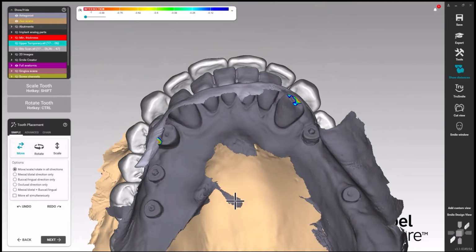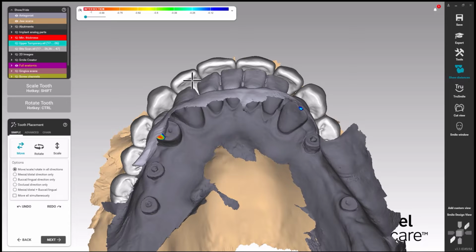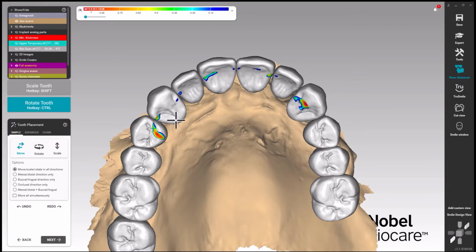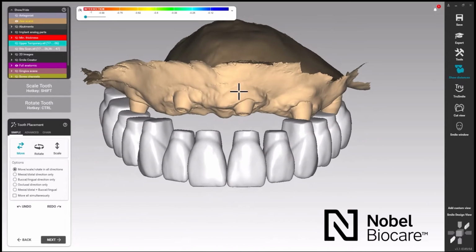Okay, so you can see it's starting to take some shape, and back in, rotate this slightly in as well, and look from a lot of different views to really help me out.